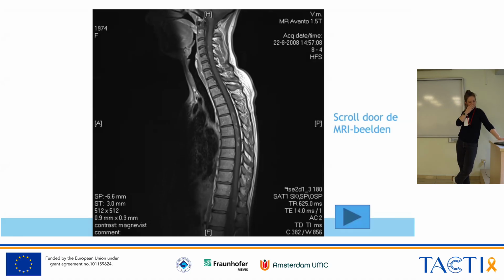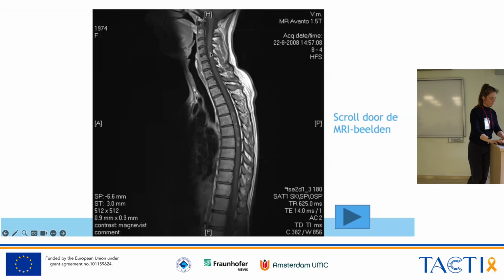Here it could fit transverse myelitis. You have to check on the T2 only if you see this. But here we have, again, smaller lesions that are in the periphery of the spinal cord, so that fits MS. Yeah, I mean, she already has her MS diagnosis.